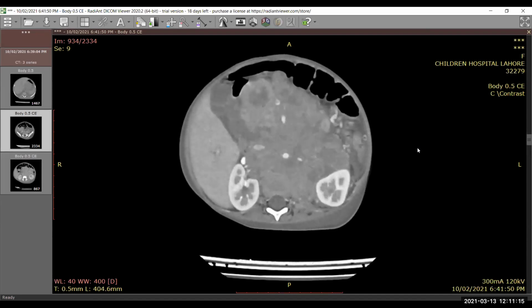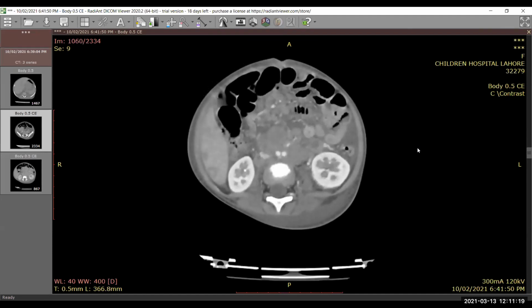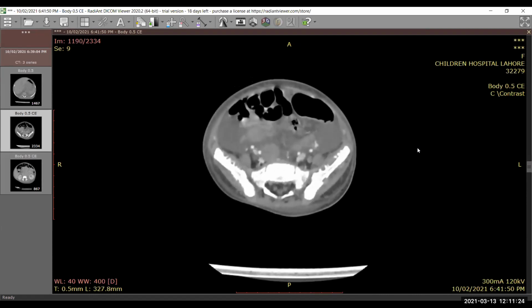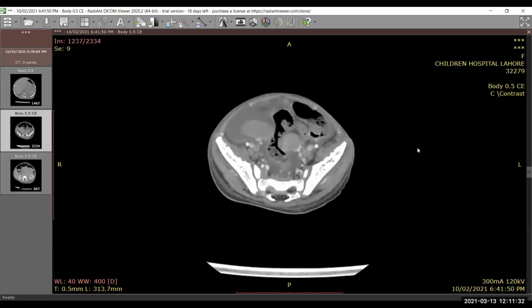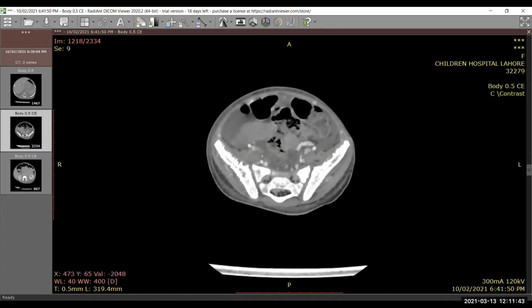So this is clearly a case of neuroblastoma. I would inform the clinician. An MIBG scan can also be done if required. And the patient would be referred to pediatric onco MDT / surgery for a multimodality management in this patient. Okay, and we will also do the urinary analysis, right? Yes, a urinary analysis for the catecholamines, yes.